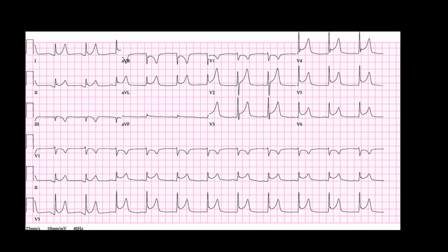And our last one here. So pause it if you need. We take a look at it. We see ST elevation in V2, V3, V4, V5, V6, even maybe a little bit out in the high lateral leads. But the ST elevation is diffuse. I see an Osborn wave present in V4, and my ST shape is smiley face or concave, indicating that this is one of the mimickers. If we were then to tell you that the patient had positional chest pain and a recent history of a viral illness, that would make this pericarditis, which is what it is.